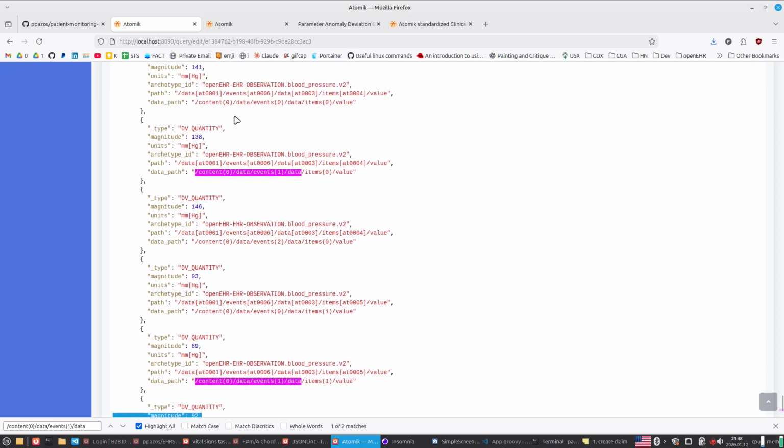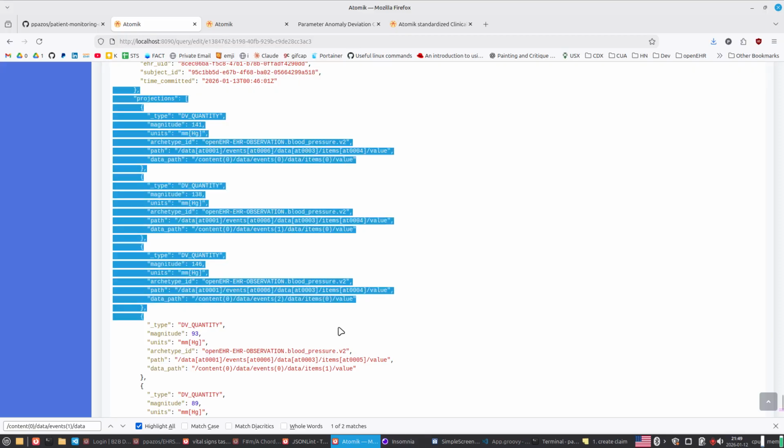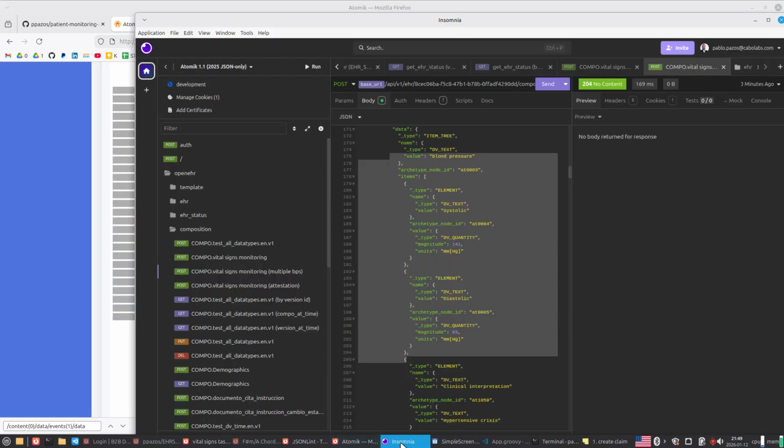So when the client receives this data, they can reconstruct the data structure, at least to match which data points go together in the tree structure, so they can reconstruct which nodes are associated. Yeah, without retrieving the whole data structure, because if you have the whole data structure, it will be easier, but it will be a way bigger result you will get in the JSON.